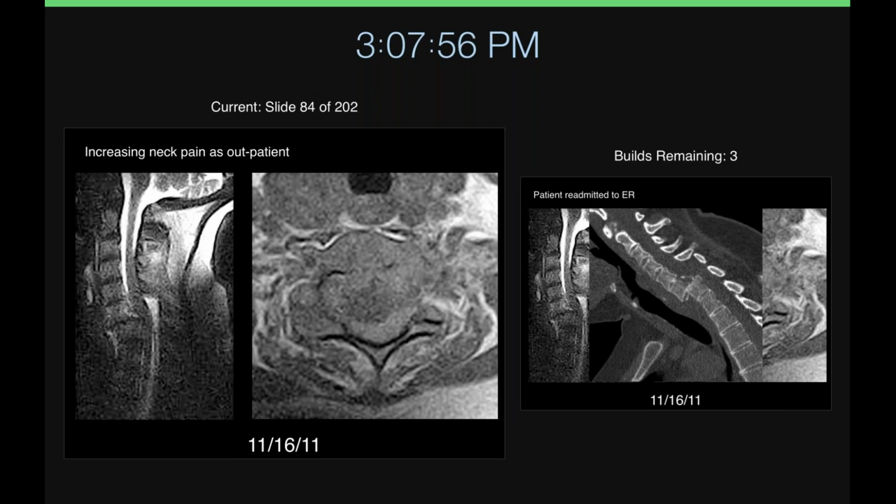Oh, there. Okay. So there is C3, 5, 6. There is fracture of C4. Yeah, C5, C6, 2, 3, 4, 5, 6, 7. Yeah, posterior angulation.